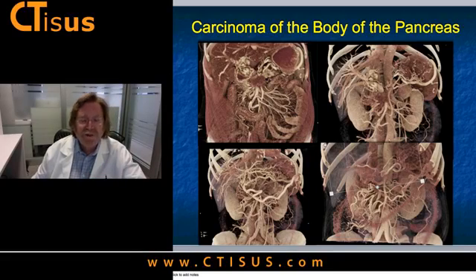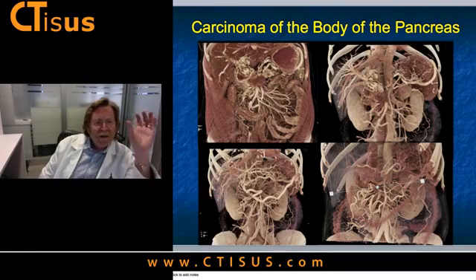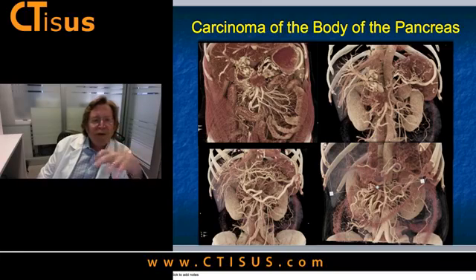And I've been spending a lot of my time doing presets. One of the challenges with cinematic rendering is that it's hard to get presets. One thing I'm very good at, modestly speaking, is developing presets. So I spent a lot of time developing presets, and I probably have about 80 or 90 presets, from liver to spleen to kidneys to lung, and you name it. So let me tell you a little bit about what we're doing, and what we've been doing the last couple of days, since Sunday, which I've been able to figure out a bit.